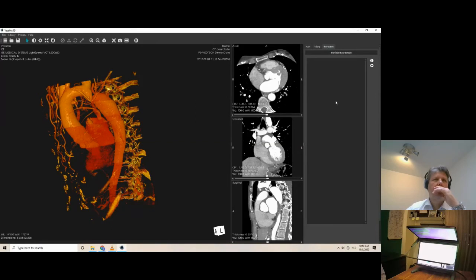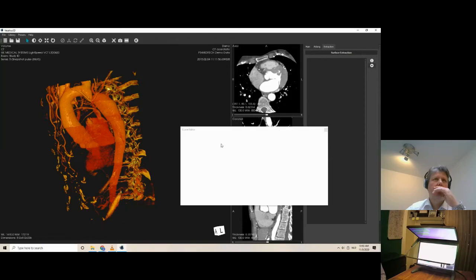We have the extraction page, and I'll go through it quickly. I want to make a basic extraction. We get a warning. Never look at warnings, doctors. No, I'm kidding. But the first step in the process is the curve editor, which will be opening up.